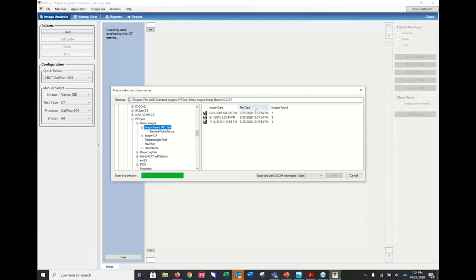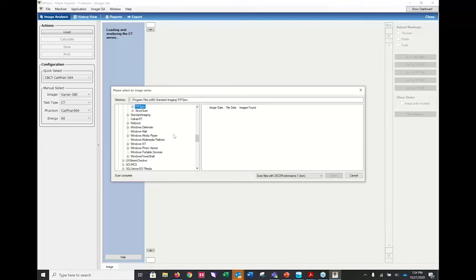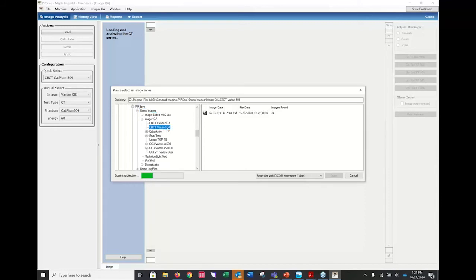My imager QA. There we go. Sorry about that.